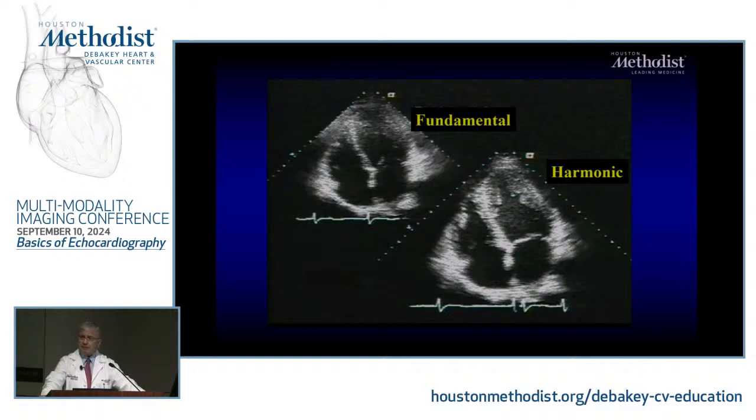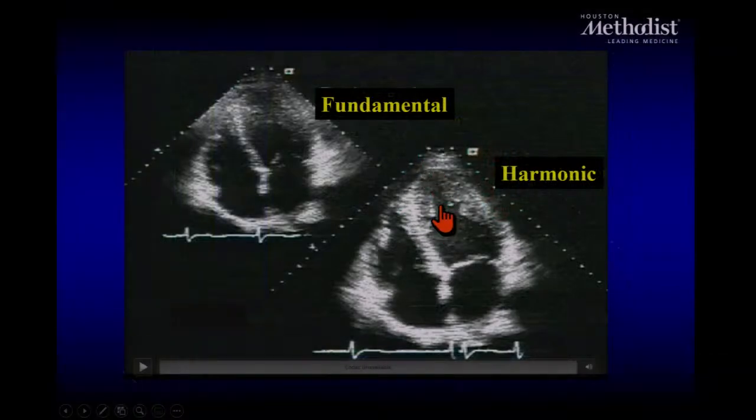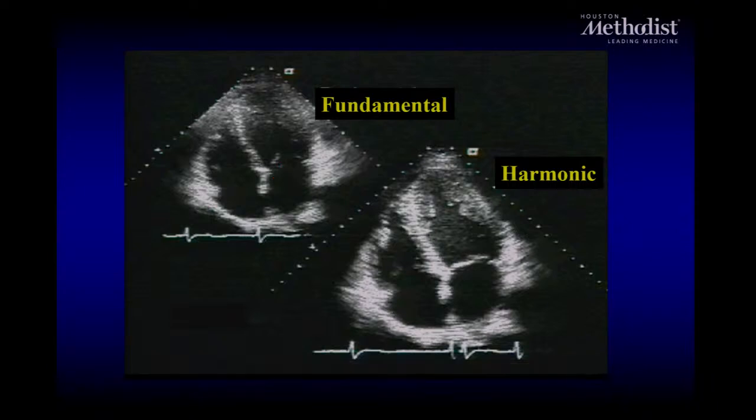It looks more like clutter. On the right one, I could see that there is some apical hypertrophy. I could see where the cavity is. This one, I can't tell where the cavity is. Okay? It's clearer, not necessarily higher resolution. The resolution is not that bad, even at 2.5.